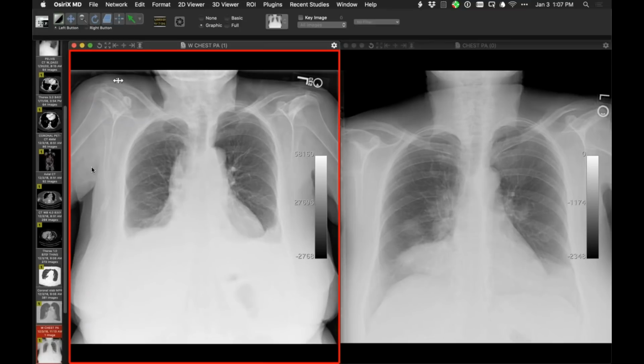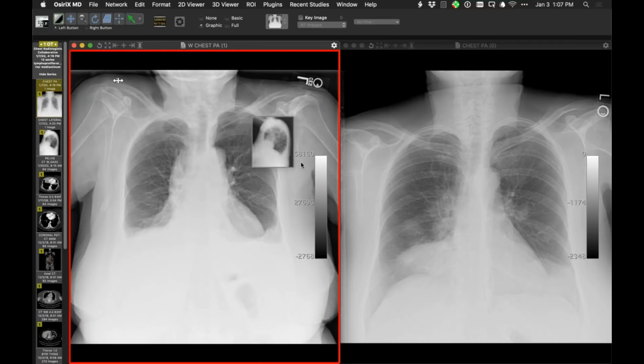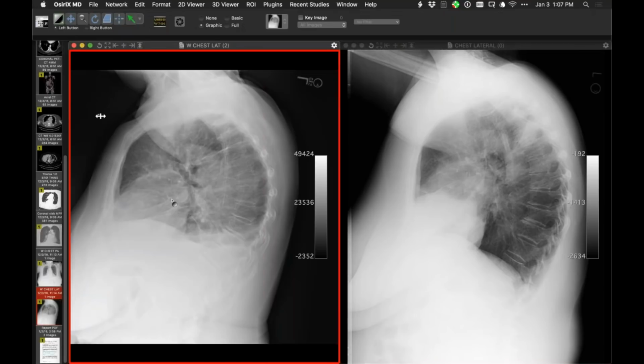So let me now bring up the two lateral projections, again for comparison. So 2002 and the lateral projection from the current exam. And I'll give you a moment to look at that. As you look at that, I will tell you that if I think there's abnormality in relation to the aortopulmonic pleural reflection, the location of it is here. So it's in the more anterior left para-aortic mediastinum. And I look for an abnormality there that might go along with that.